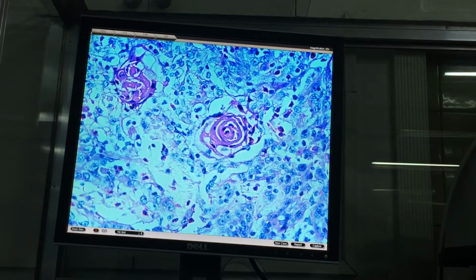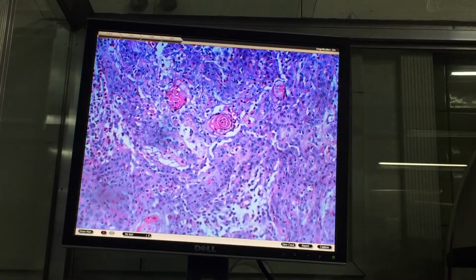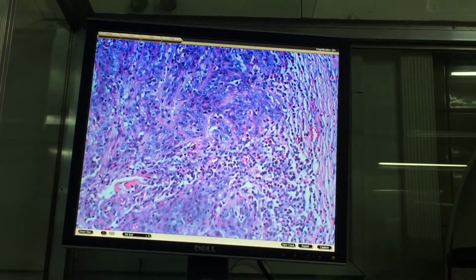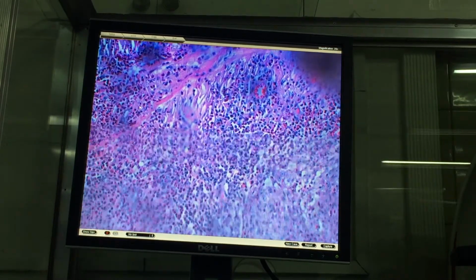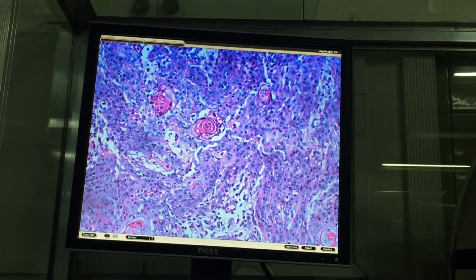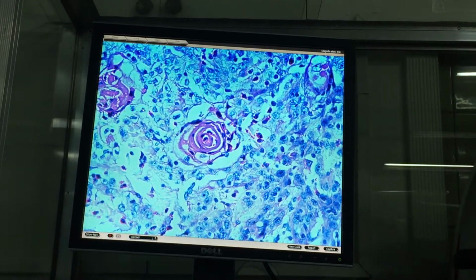You see this as the most common tumor of the oral cavity and the larynx, squamous cell carcinoma. Anyway, I think most of you got that. Keratin pearl. But as you can see, around it are squamous cells.